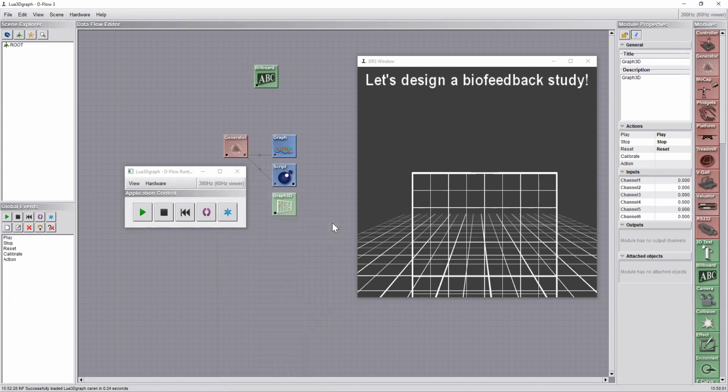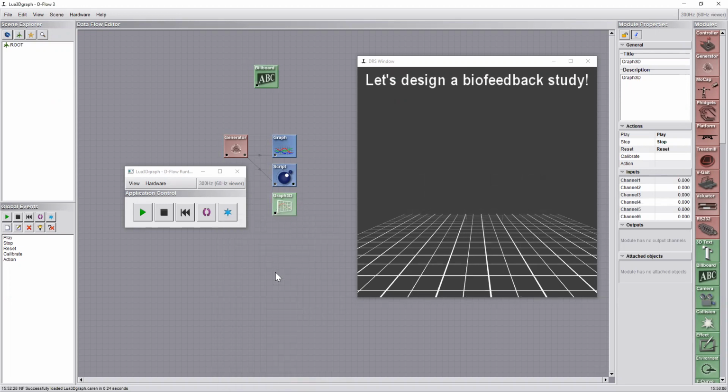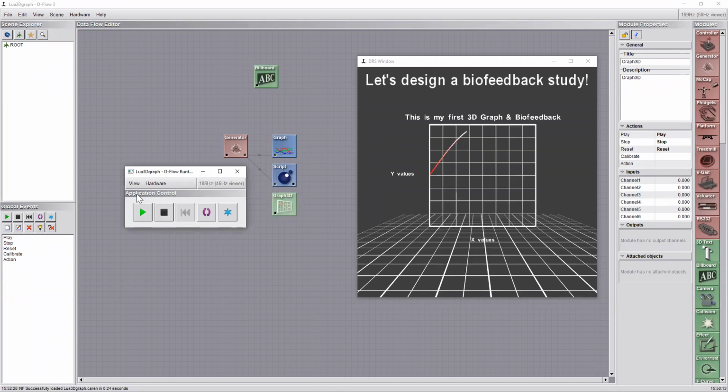But some of you would be interested in knowing how you can do this programmatically so that you can access many things in that table, in that graph. So have a look at what I've created for you here. What I've created here is just a script. It has nothing to do with this graph. It has all the labels and the title and the graph itself. It can be shown to your subject or participants as quickly as possible, as you can see.